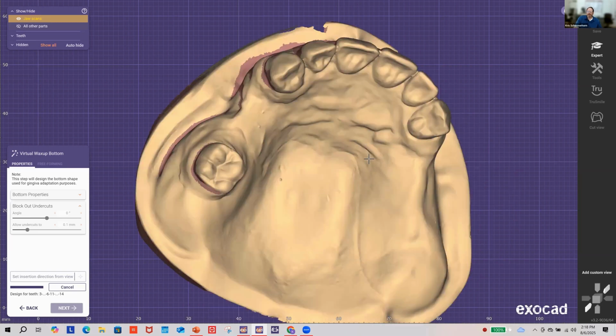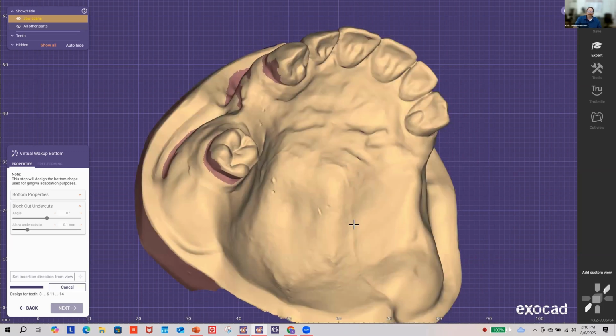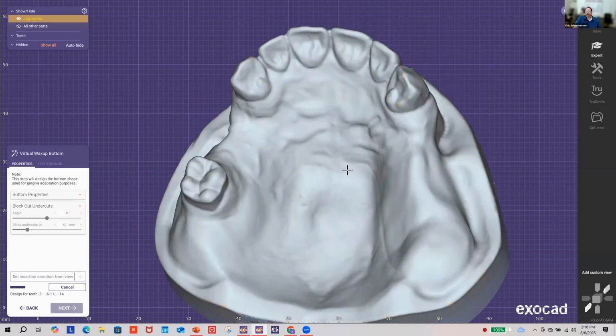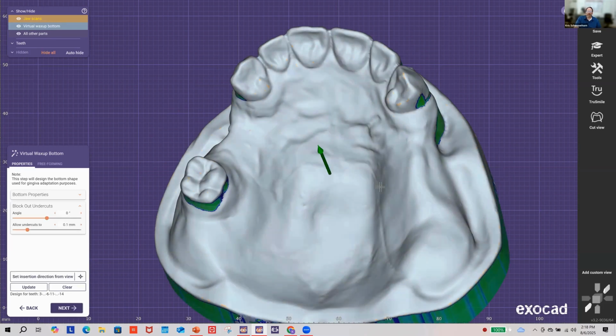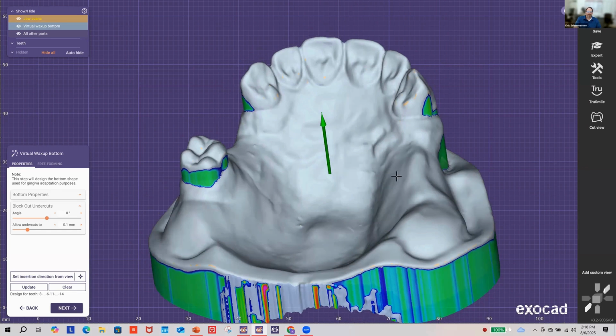And so flexible partials, the reason that they're so comfortable is because they flex and move with the mouth and the body. And so putting a really heavy bead line in there, I think can possibly cause a bounce on this tail end. So the doctor puts it in the mouth and there's this little bounce on the tail end. And what's happened is it's flexed around that bony area, didn't sink in, didn't smash that tissue out of the way. And then the rest of that is kind of out of whack. And so that's why if I put a bead line at all, it's very faint. So do as you may, that's my experience with it.